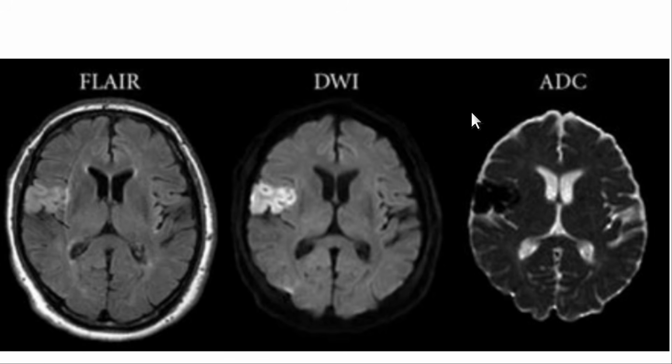Okay. And so the way I would remember this is A for ADC. A is the first letter of the alphabet, so I remember A for 1 week. This stays abnormal 1 week. I remember D for dos, number 2 in Spanish, so D for dos meaning it stays positive for 2 weeks to 2 months. Okay, that's how you think of things. So you can time all these infarcts, and that's what I tell young doctors when I'm training them.